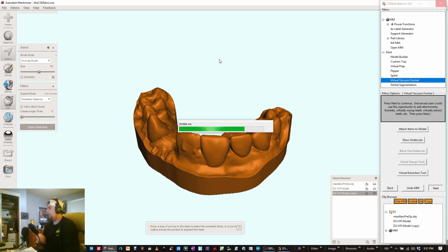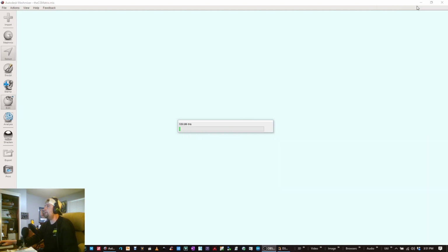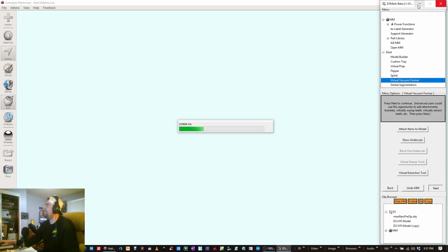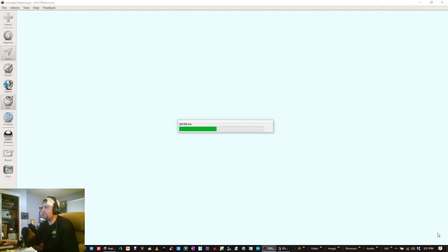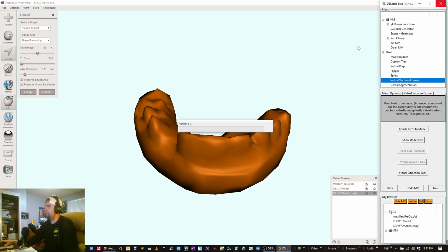Again, let's see, I don't want to ruin anything, but I'll minimize this. Yep, did it. I ruined it. I was going to say, when this application is in here, in the bottom right corner of Mesh Mixer, you can see how many triangles your particular selected model has. And I think this one is pretty significant, maybe like 360,000 triangles.